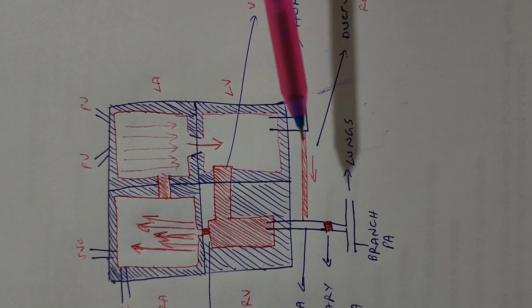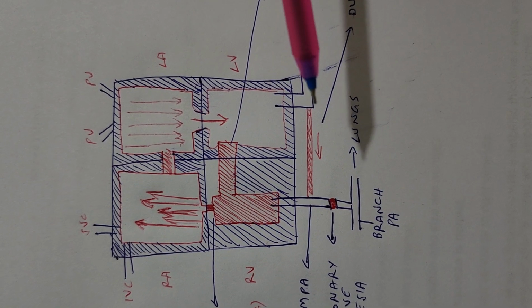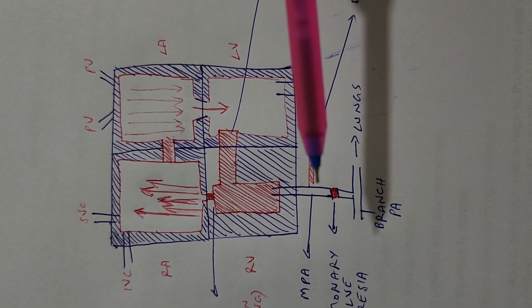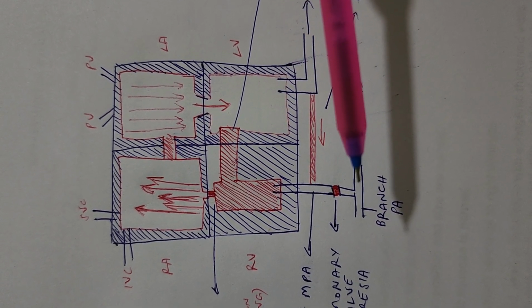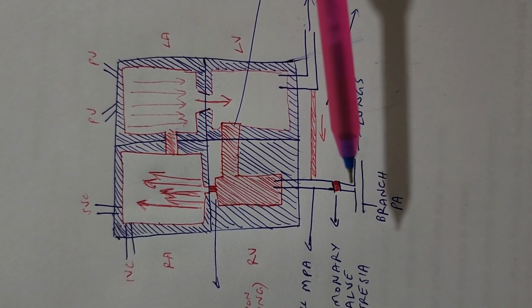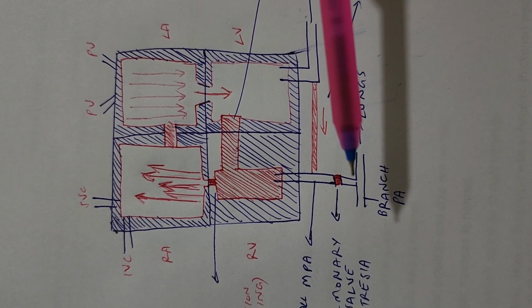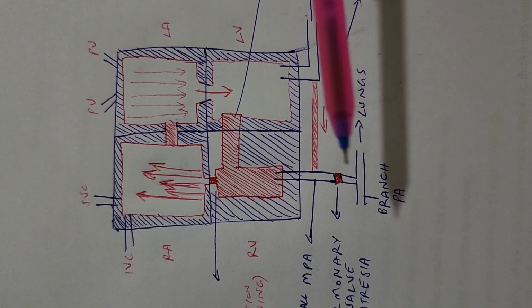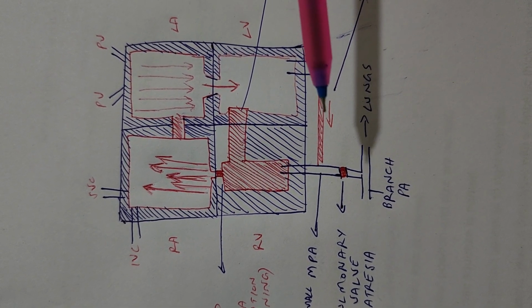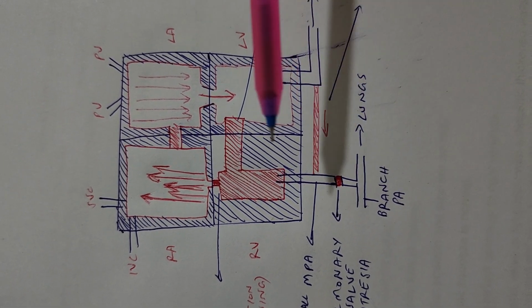However, from the aorta across the ductus arteriosus, blood flows from aorta to pulmonary artery in a reversed manner. So this reversed flow is what keeps the blood going into the lungs. Actually this has to land here. The drawing shows it here, but actually the duct will come here beyond the pulmonary valve occlusion. So the branch pulmonary arteries in this patient were patent and they were receiving blood from aorta in a reverse manner across ductus arteriosus into the lungs.